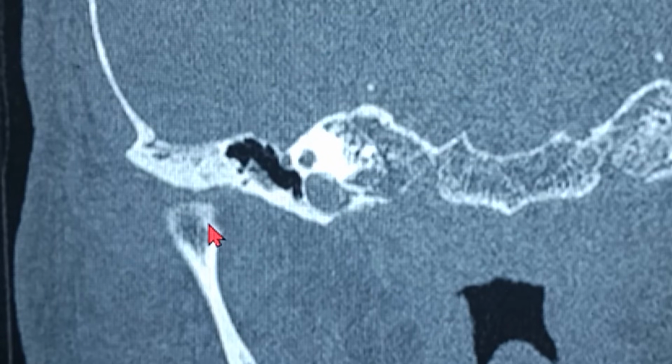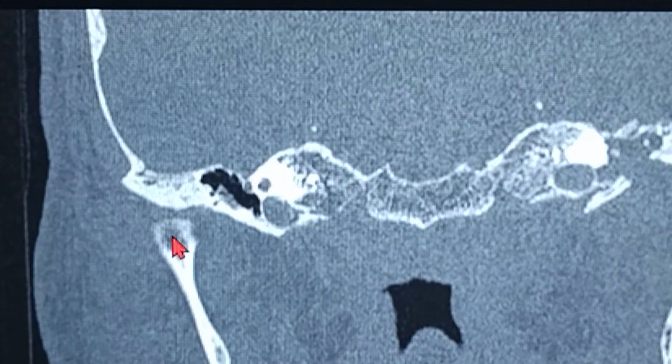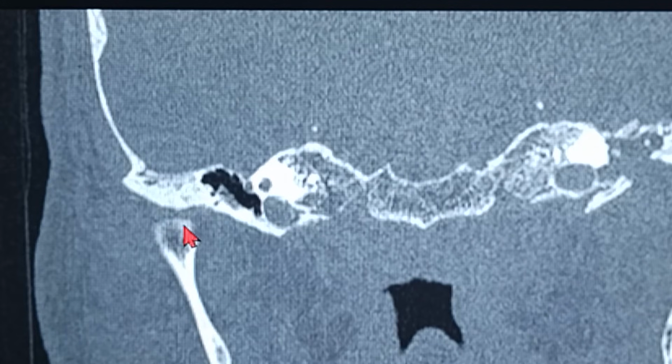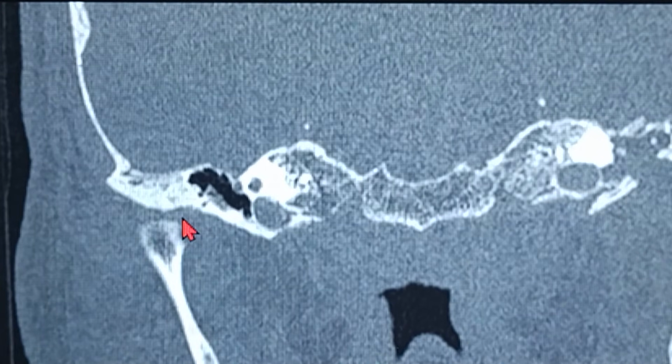The very first thing you have to focus on is the mandible, the TM joint. If in the exams you're given the temporal bone for your spotters and you're given a coronal view, always first visualize the TM joint, and from the TM joint you can proceed behind.